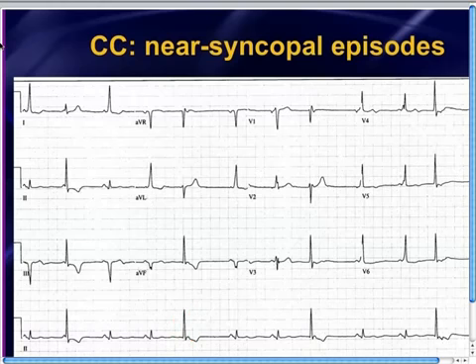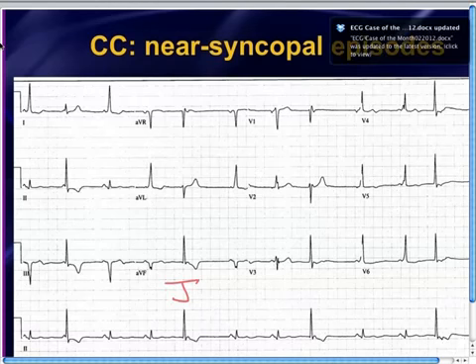Well, there's no P wave preceding the QRS complex, and so this is not a PAC. Furthermore, you notice that it's a relatively narrow complex, and right after the QRS complex there's a little blip, which consistently occurs in all of those premature complexes. There's a little blip right there also. These are retrograde P waves. So there's no preceding P wave with normal PR, it's narrow, and there's a retrograde P wave. There are three things telling you that this is a junctional premature complex.